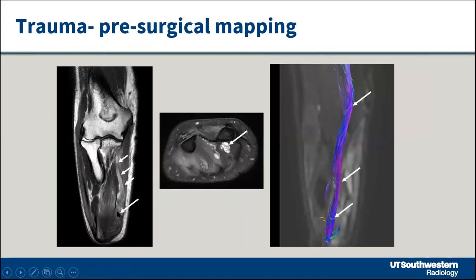So here's a median nerve neuroma, and that's the area of the stump. And you can see most of the tracts are maintained. And he also gets electrophysiology for that. So this nerve is functional. He could connect to that after cutting through the neuroma.